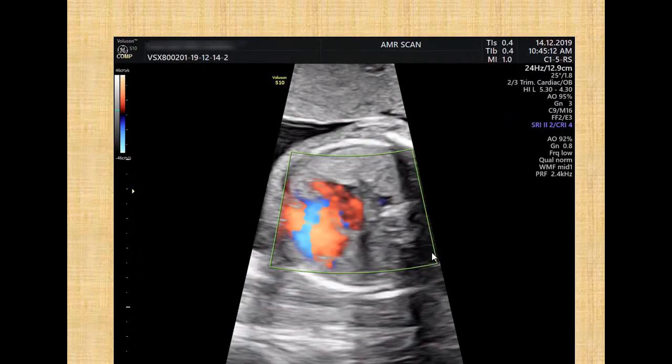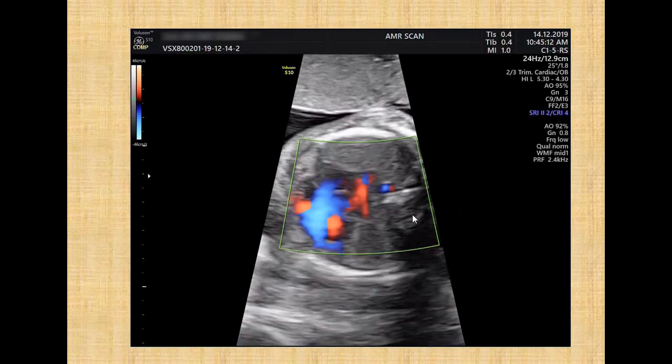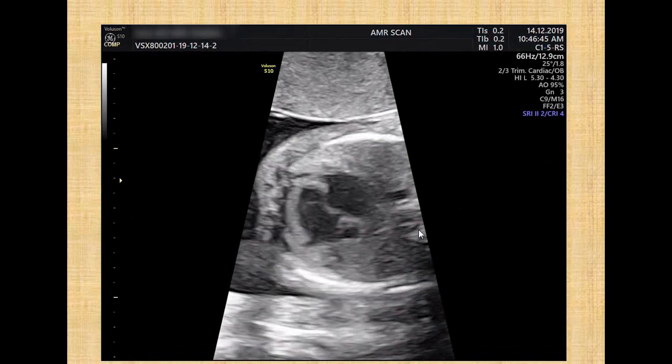Here is a group of pictures to clarify the aforementioned findings. Regurgitation at the level of the tricuspid valve, normal pulmonary venous return, and the atretic mitral valve with the broad-based right atrial appendages denoting heterotaxy with right isomerism. The VSD and the common atrium.